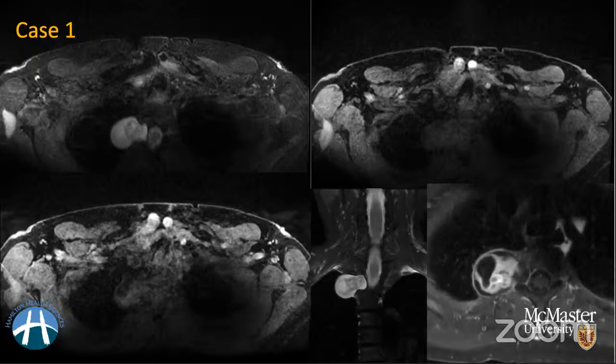So this case points to a teaching point that even if your organ of interest is somewhere else, you have to look at all the corners, and all the sequences that you have, so that you don't miss an incidental lesion like this schwannoma. This was just an incidental pickup, and something to remember in terms of differential diagnosis for target sign.